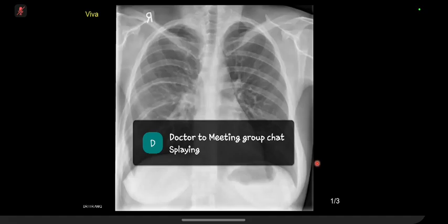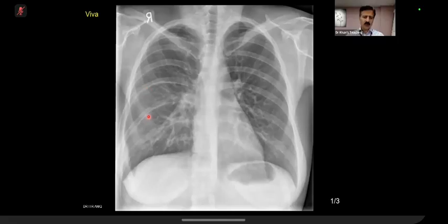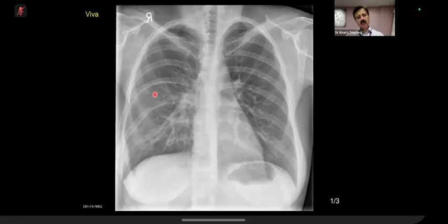There's an area of well-defined periosteal reaction in the right rib of an adult patient. Or here? Yeah. Oh, okay, so it's multiple ribs then. So in an adult, my first concern would be metastases. Actually, this is not a periosteal reaction. Maybe for you it is projecting like that. So let me guide you. There is no periosteal reaction. What is your conclusion with these ribs?